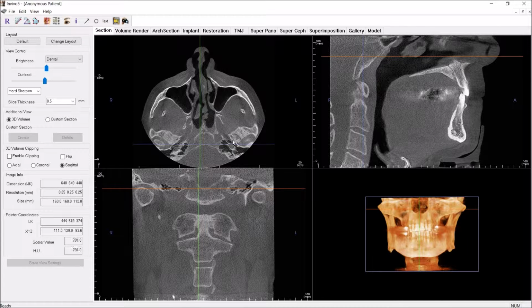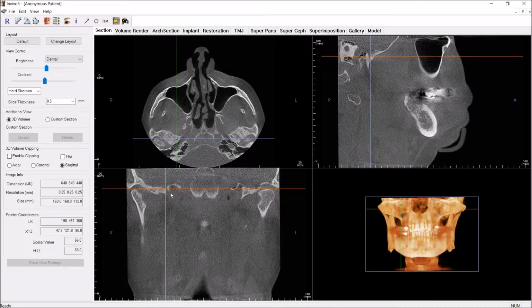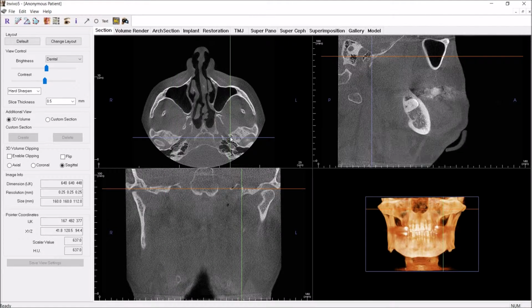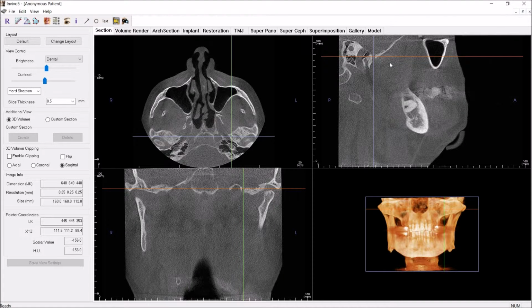And here I see a couple things that look like foramina. Something here, kind of a similar thing on the other side. So these are bilateral. These are a natural anatomical structure. You can look at it in other planes. You can definitely see it's a canal. So drag this over here now. And what that is, the Foramen Spinosum, if you remember from anatomy.